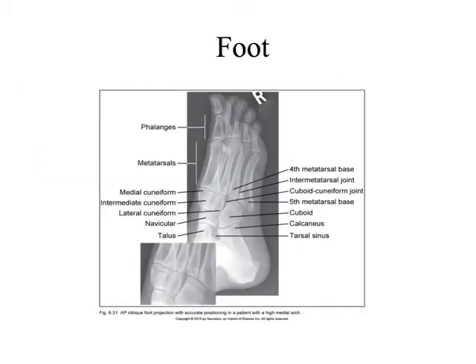What image are we looking at here? Oblique. AP oblique. Okay? I think it's AP. So we have, that's a good question though. Dorsal plantar surfaces of the foot, right? For anatomical position, the dorsal surface of the foot is the anterior surface, right? It's one of those places where things get flipped upside down. The plantar surface of the foot, we're going to consider the posterior surface of the foot, okay? So, AP oblique projection, all right?